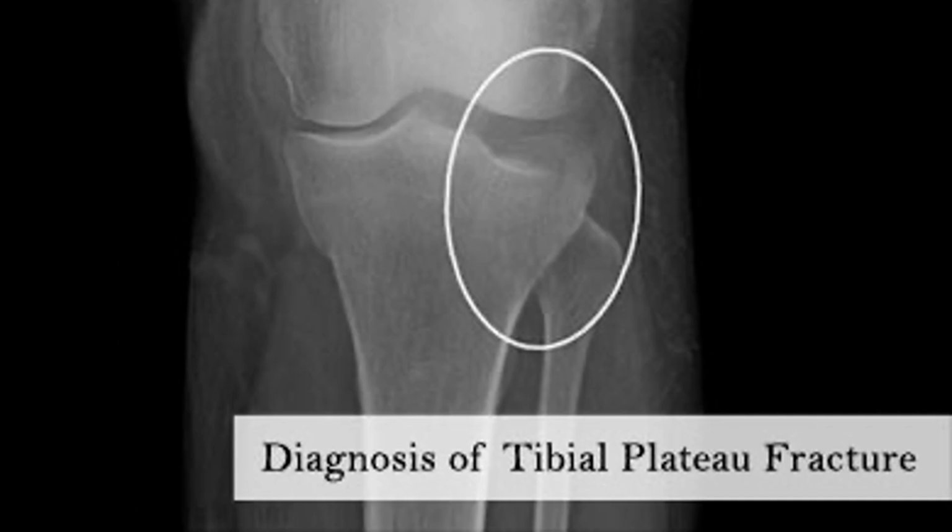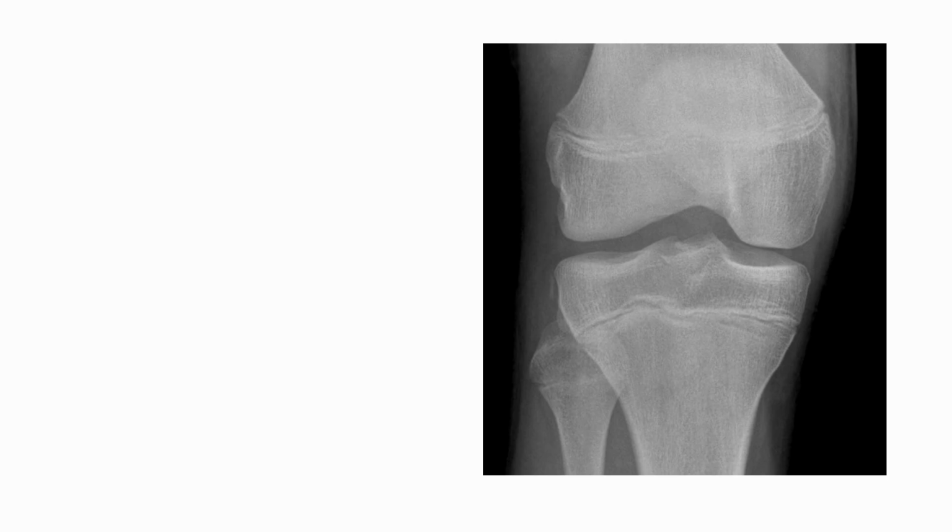Now this is a tibial plateau fracture, very classical. The common complication which happens is compartment syndrome. Need to think about tibial plateau fracture. Now here it's not very clear.